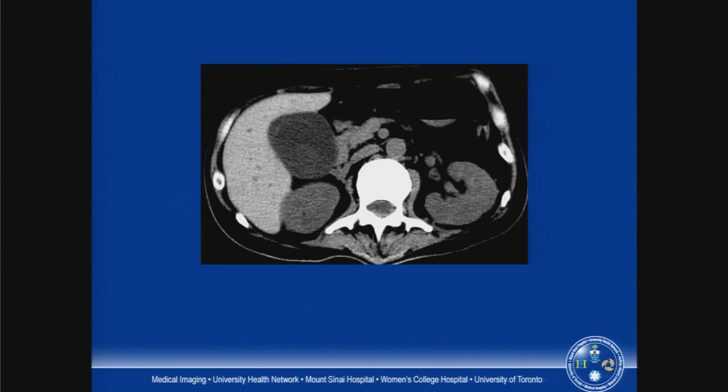A man who had pain for 8 to 9 days came to emergency and had a renal colic CT scan for what I suspect was fairly non-specific abdominal pain. There were no urinary tract calculi, but we did note a distended gallbladder, and when you look carefully, there's a high attenuation line within the gallbladder lumen on this unenhanced scan.